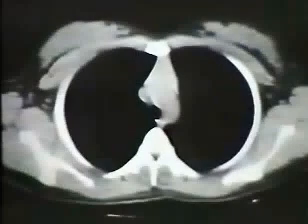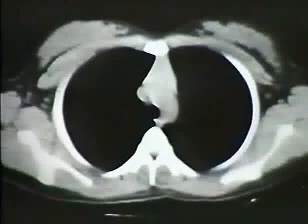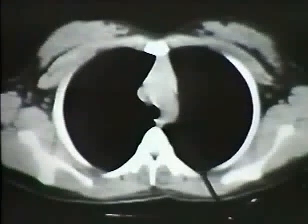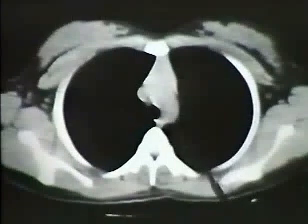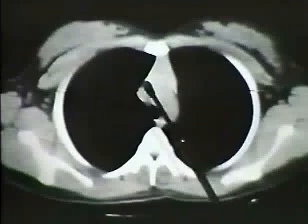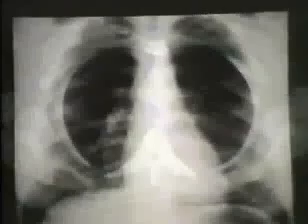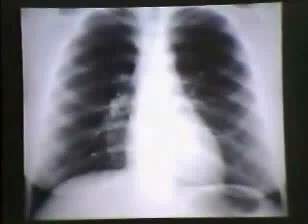Here's another funny appearance in the superior mediastinum. And indeed, when you start looking at younger adults, or even children, as opposed to older people with nice tortuous vessels and a lot of fat in the mediastinum, you're going to see some funny things. Here, without contrast material, we see this rather plump shadow in front of the aortic arch, superior vena cava over here. Esophagus is blending into the aortic arch shadow. Now, the chest film on this patient was not too remarkable. This was, in fact, the cause for the study.